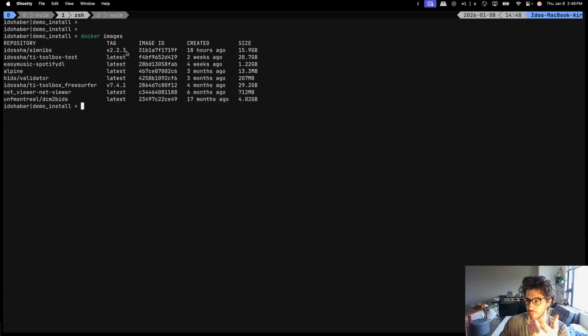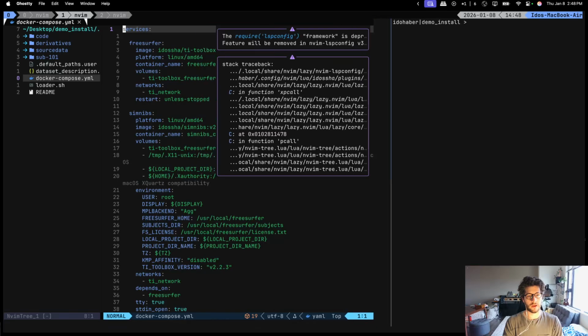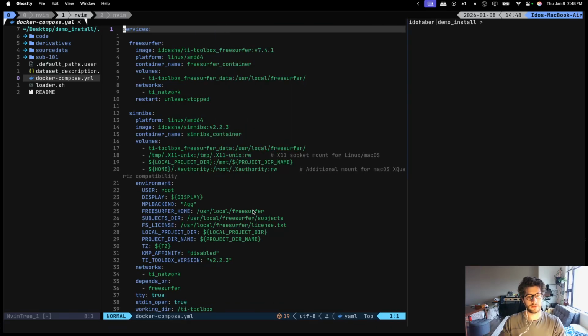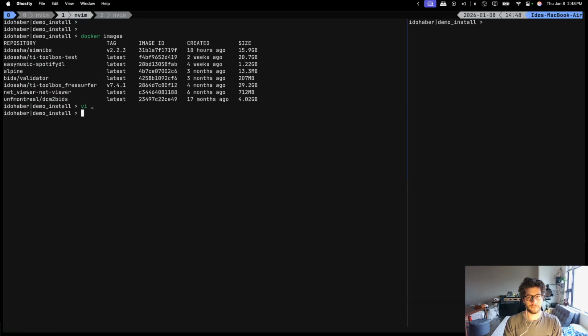You can have multiple versions, and if you are using the command line, then you can jump between different versions simply by changing the number here. This is a little bit more advanced and maybe unnecessary, but I think it's good to know.